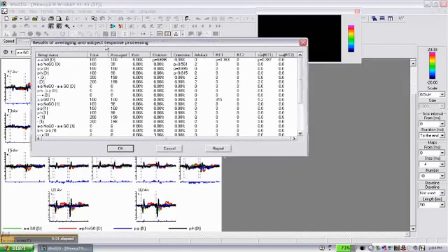We open this window, which is results of averaging and subject response processing, and you see p-values of computing the deviation from normality. In this case, the p-value of deviation from normality in omission errors is 0.7, which is normal.